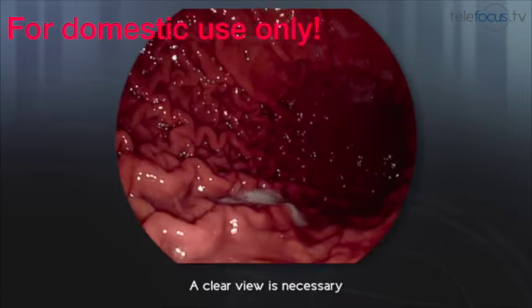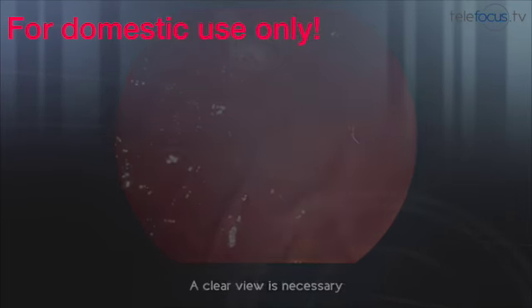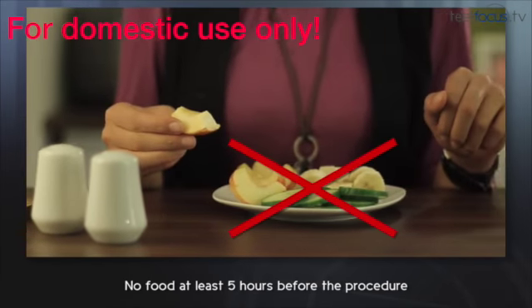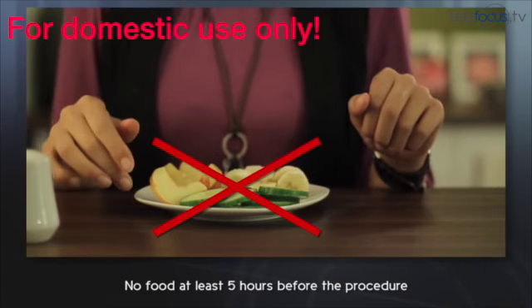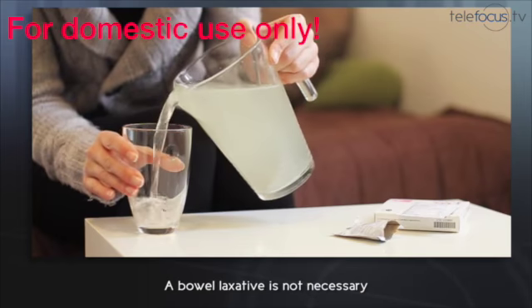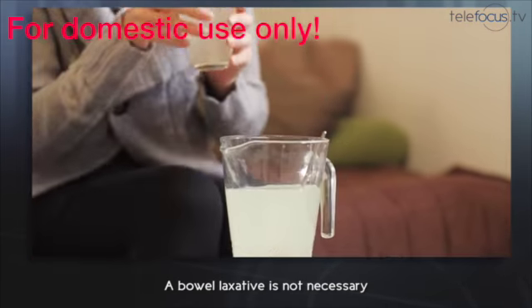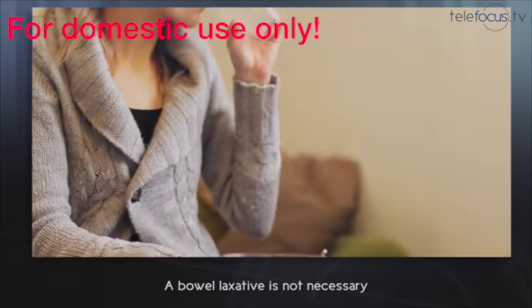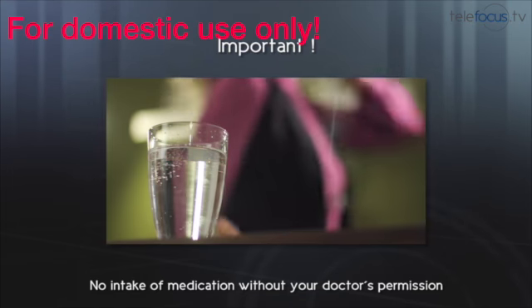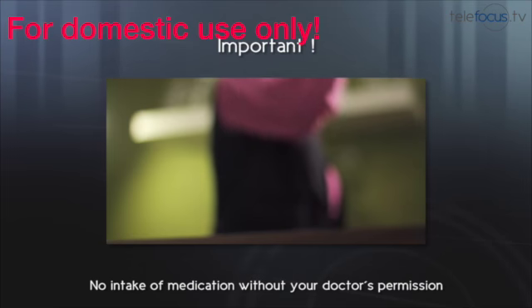It is important to have a clear view on the examined organs. Therefore, you should not eat or drink for 5 hours before the test. A bowel aperient as used before colonoscopy is not necessary before gastroscopy. Medication that increases the risk of bleeding must be paused at least 5 days prior to the examination. You should talk to your physician about your individual medication.